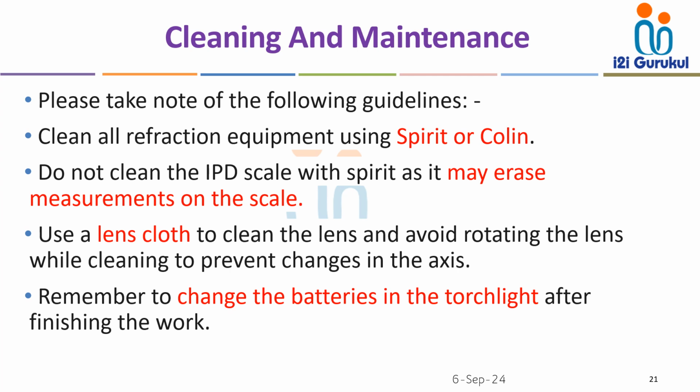Please remember to change the batteries in the torchlight after finishing the work. So these are the important points to be considered. During maintenance, the trial frame is wiped with a soft cloth to keep it free from dust and should be wiped between patients. The trial lenses can be cleaned with glass cleaner or a soft cloth.